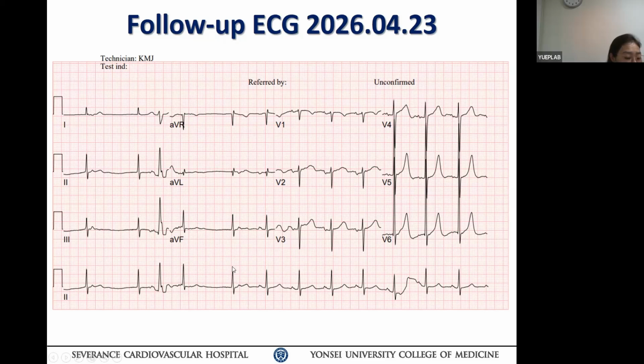So it's possible that at the time this junctional beat came, a sinus P wave also came, but because it was still recovering, it did not conduct. The PP interval is the same as this PP interval by calipers. So it is either a sinus beat which came almost immediately with the junctional beat but found the AV node refractory and did not conduct.